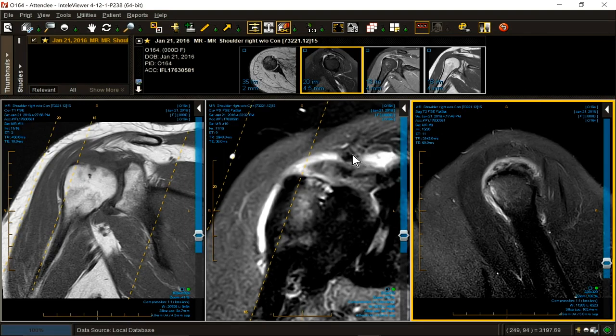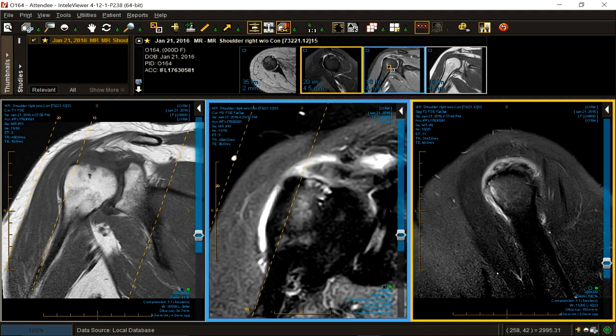So there is a small, chronic, or subacute, full thickness tear with interstitial dissection into the midfibers of the supraspinatus, with a slightly swollen infraspinatus, with peritendinitis, a remodeled humeral head, pitting, and hypertrophic tendinopathy with tendon fiber failure.